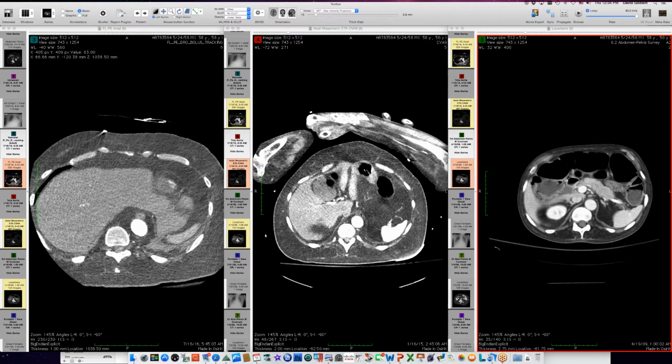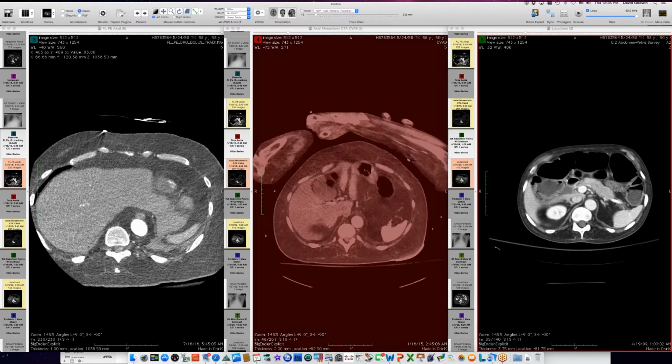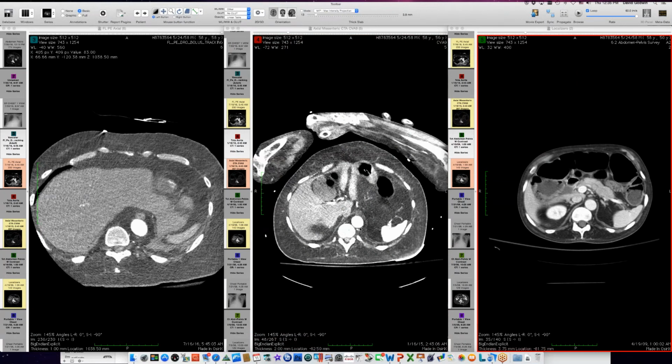So the muscle is becoming faint and interspersed with fat. And then on our current exam here, the crus is just almost invisible. So the diaphragm muscle is really atrophied dramatically with this polymyositis, this muscle disease. And what we see of crus is largely replaced now by fat.